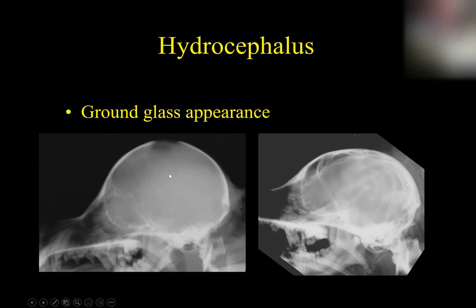Normally, that hole should fill in with bone pretty quickly after birth, to where it ends up looking like that. Typically, you can see a little vestige of it right in here. That used to be probably the dorsal fontanelle, but in this dog, it filled in with bone. There are some dogs, though, where the dorsal fontanelle will never fill in with bone.